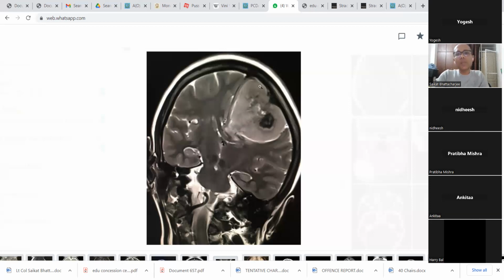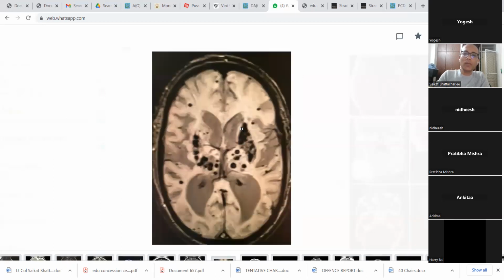This is not a post-contrast image, but hemangiopericytoma will be so much less common than a meningioma. Plus, there is no real destruction of tissues around it. The bones seem to be okay, and it seems to be respecting the dural margins very nicely. So meningioma, or DD as a hemangiopericytoma. Otherwise, you can also say dural-based mass.